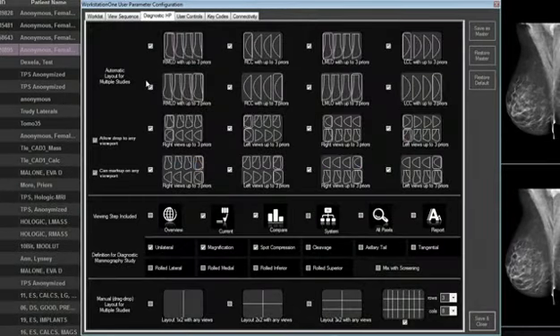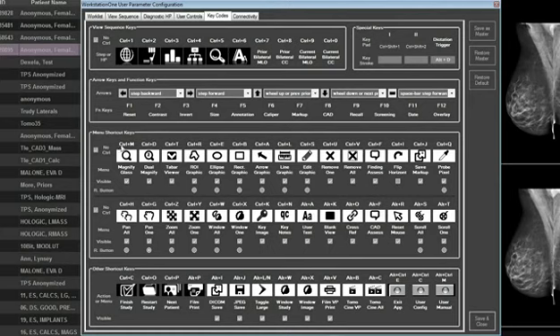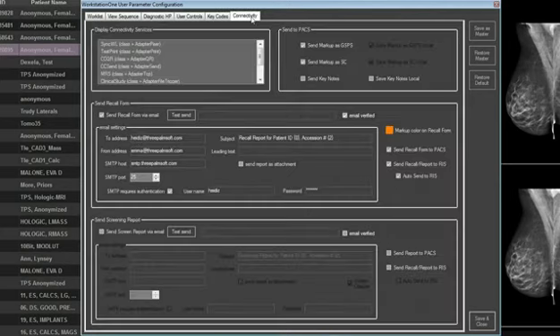In the Diagnostic Hanging Protocol tab, set how the workstation defines a diagnostic mammography study. Under User Controls, choose font sizes, markup thickness, and change tool button and annotation positioning and visibility to your liking. The actions that are taken by certain keyboard keys are listed on the key code configuration page. Finally, the Connectivity tab displays the configured DICOM parameters. Indicate where to send the recall form and the user markup here. For example, send to PACS as a DICOM GSPS object or screen capture.